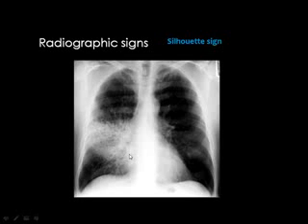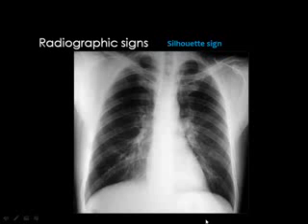And the heart is an anterior structure, so this opacity is anteriorly located. And the anterior part of the right lung in this area corresponds to the middle lobe. Then you know that this opacity should be present in the middle lobe without the need for the lateral view.